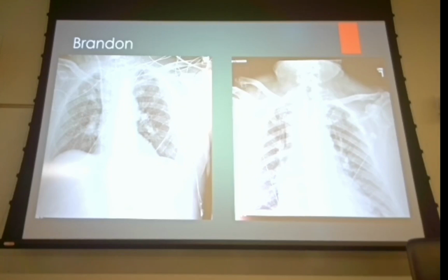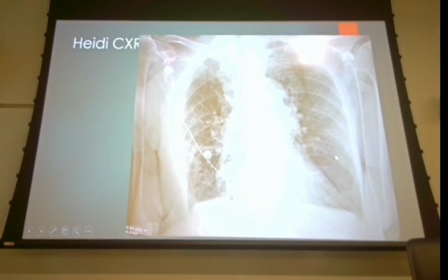Cut off at the bottom. Yeah. Again, probably put the top of the image receptor above the elevated shoulders, probably AP supine. Yeah, that should be a repeat, in my opinion. A little bit of rotation.